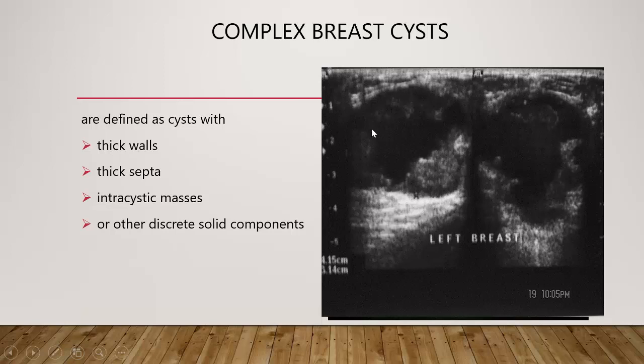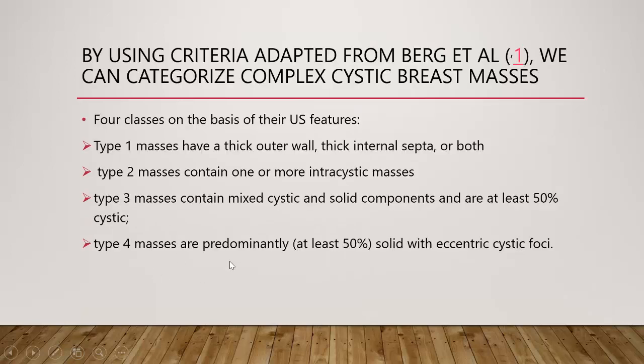In this case, there is non-uniform thickening or a predominantly solid lesion with cystic component inside. Mostly this was a tumor with necrosis inside, so it behaves like a malignant abscess. This is the necrotic part, and this is the solid component outside the lesion, so this is central necrosis rather than cyst.